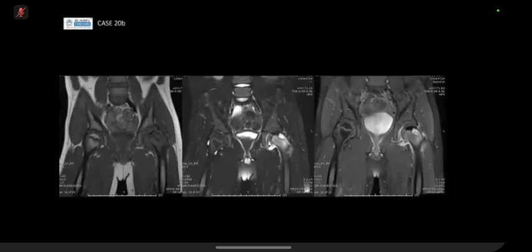So you've got another MR. We did MR on this child. Do you want to talk me through this? Does it confirm or refute what you initially thought it was on X-ray?